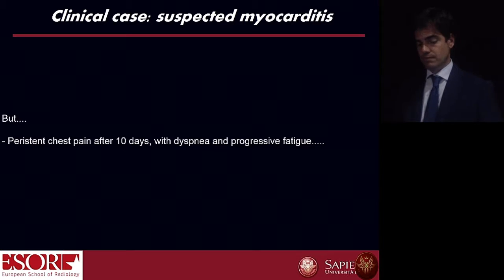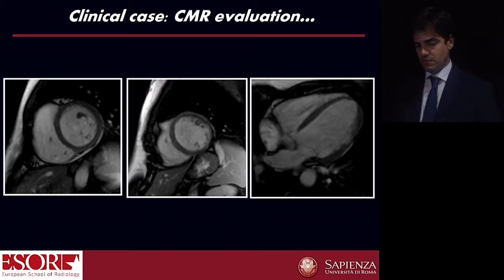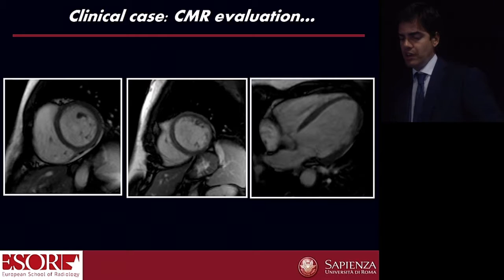Let me show you MR. Look here. Short axis at the basal mid-ventricular level, short axis mid-ventricular, and 4-chamber view.